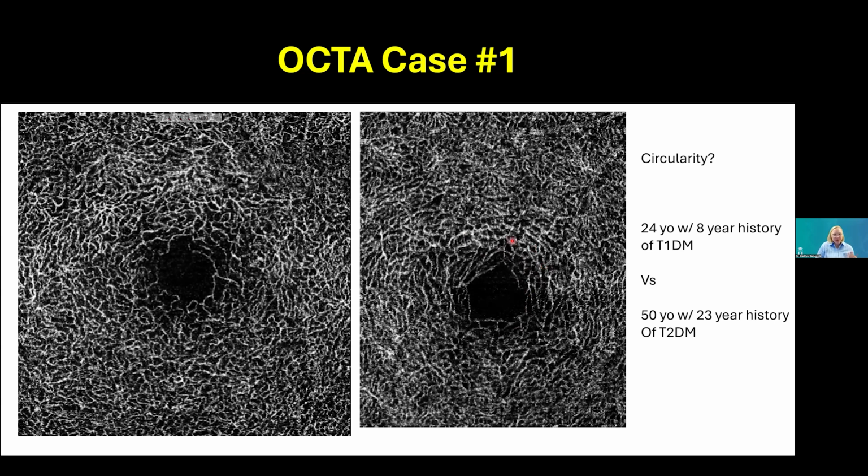Vascular patterns from patient to patient vary tremendously, and particularly the size of the foveal avascular zone. There's a huge range of the size of it in the normal population. So I would encourage you, especially in these patients that don't have clinically detectable retinopathy, not to jump to conclusions. Make sure you're getting longitudinal data and seeing how that FAZ is changing over time.